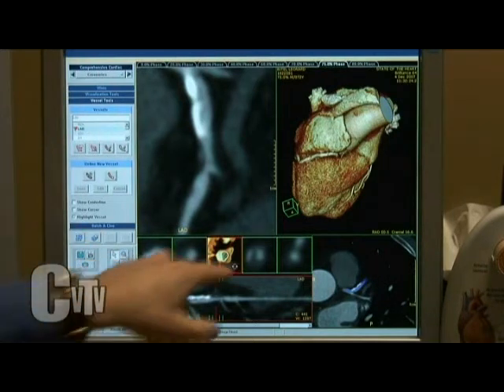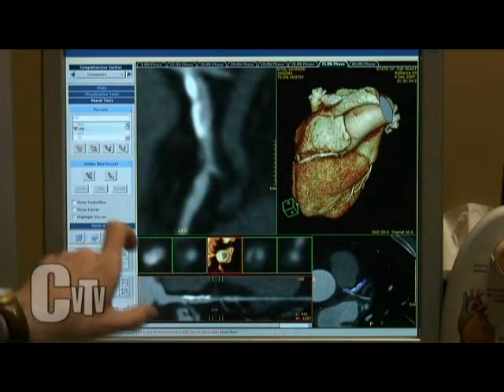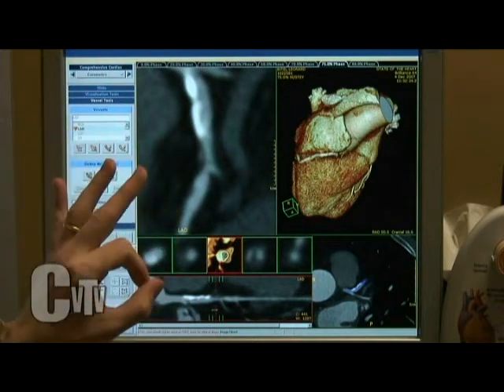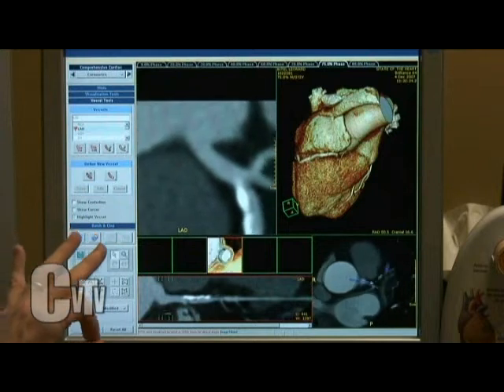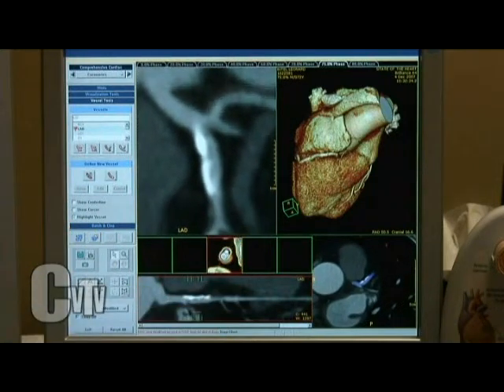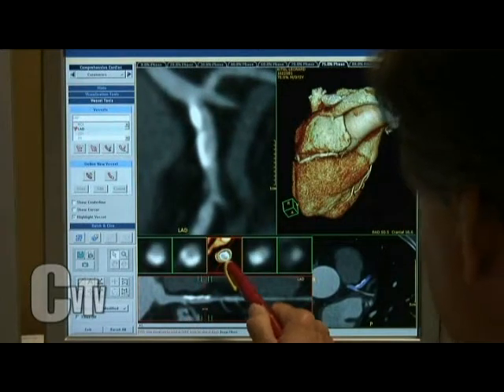So what this means is we can take all this data and then convert it to this image here, where if we were to translate all this to a three-dimensional view, we were to shrink ourselves and do the fantastic voyage in our little microscopic submarine down the coronary artery, that's what it would look like. Okay, so go slowly here for one. Could you go back to the beginning, and let's go slowly to make sure that people understand what you're saying.